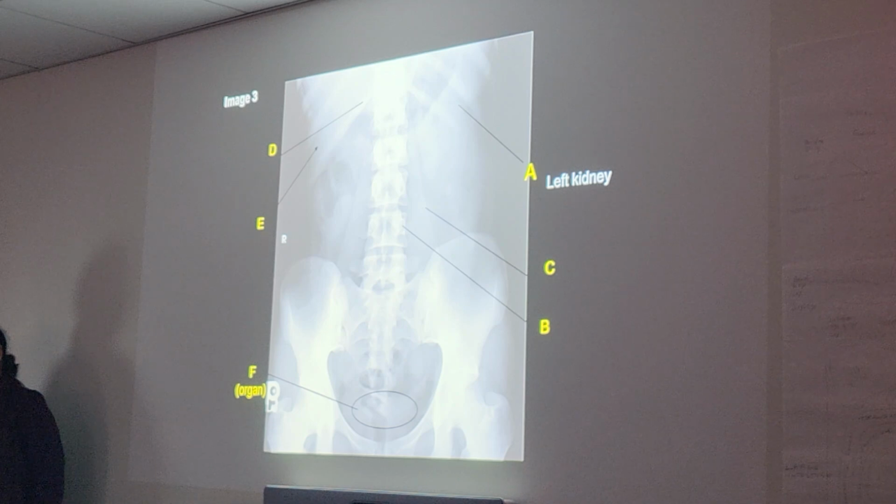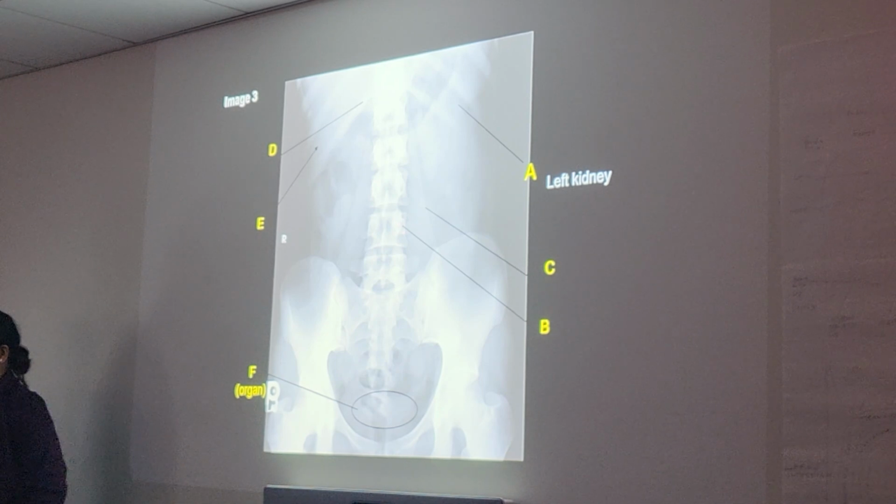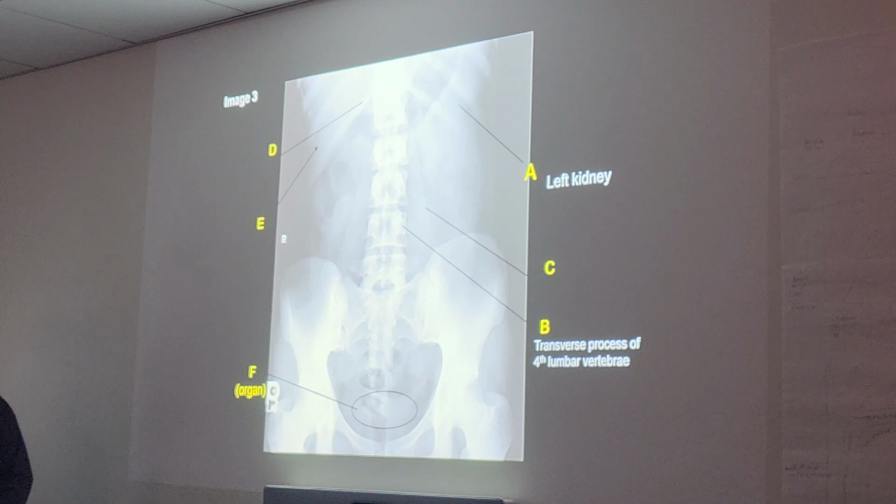Is it the fourth pedicle? Is it the left? I think I heard somebody say it. Shemaiah, go ahead. To me, it's a transverse process. Oh, I thought you said L4, left pedicle. What she said? I thought you said B. Oh, transverse. It should not be, pointing at the transverse. So wouldn't it be a little bit more out the wing?